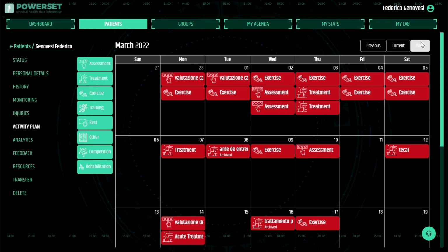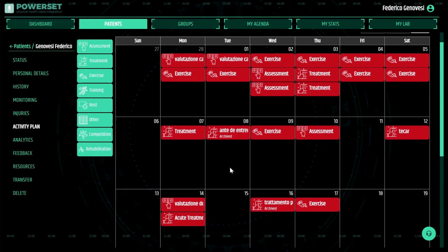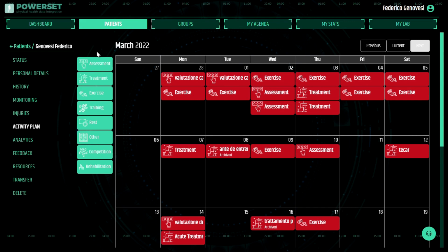Hi everyone, in this video we are going to see how to manage the activity plan of the patient with the system Powerset. When we are inside the patient profile on the activity plan of the menu, we are not speaking about the activity that we are going to do as a professional. Everything that is related with us as professional is on my agenda.